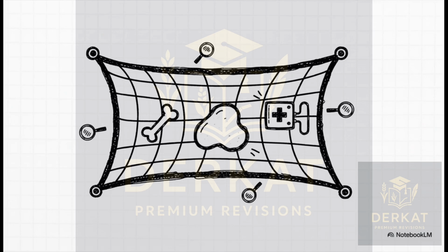And finally, we have E for everything else. This is your safety net. It's the step that makes sure you haven't missed anything. You're going to deliberately scan the bones, the ribs, the clavicles, the vertebrae, looking for any fractures. Check the soft tissues for any swelling or air, and don't forget to look for things like breast shadows, which can sometimes look like pathology in the lower zones. And of course, identify any lines, tubes, or pacemakers, and make sure they're in the right position.